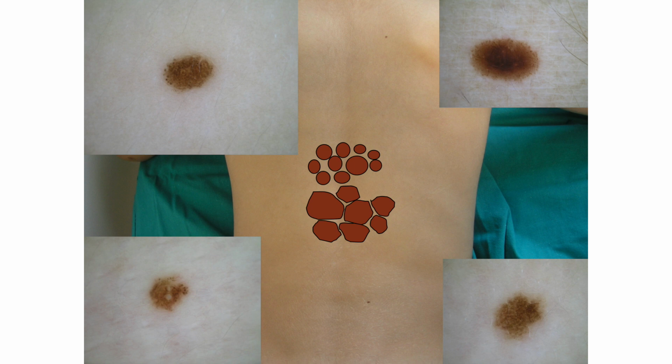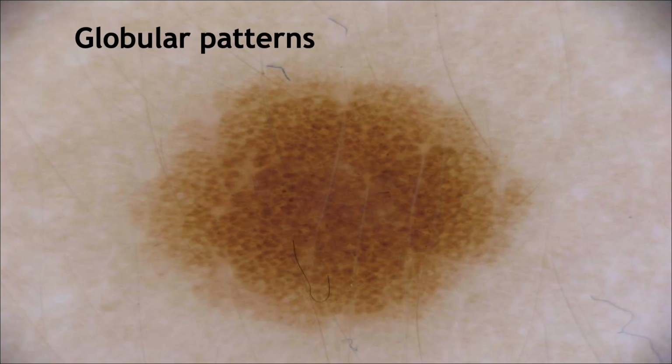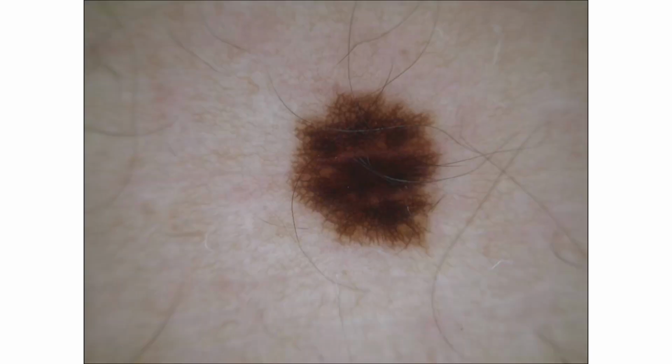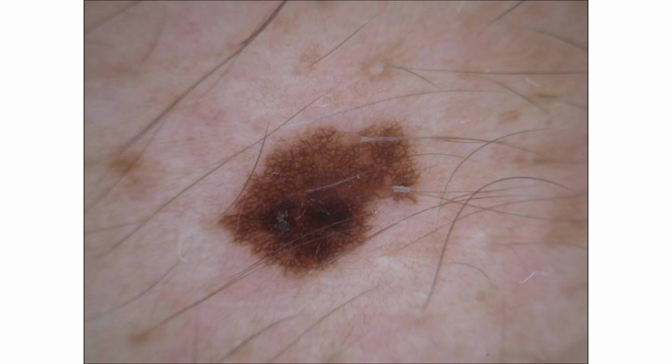So, for example, in this young guy, most of his nevi are globular or homogeneous globular patterns, and all of them are very similar to each other. In contrast, in this lady with skin type 3, many of her nevi are reticular, hyperpigmented, and smaller, which is typical in this phototype.